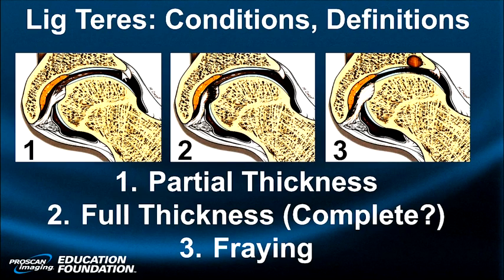So when you start to see razor-like fissures or something you think is a sulcus that's deeper than, say, 10 or 15%, it's going to be a labral tear. That doesn't mean it's symptomatic. The hyaline cartilage on both sides is going to add up to about 3 millimeters throughout the hip. You're also going to see a ridge or an area of irregularity where the triradiate cartilage comes together, and that is known as the stellate crease.